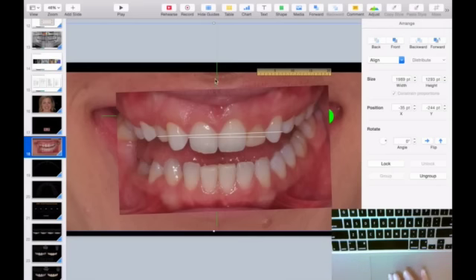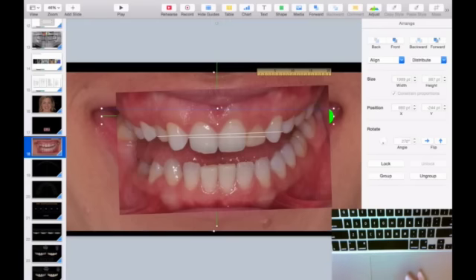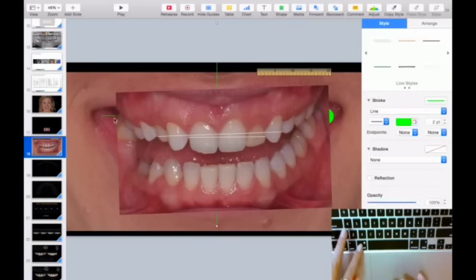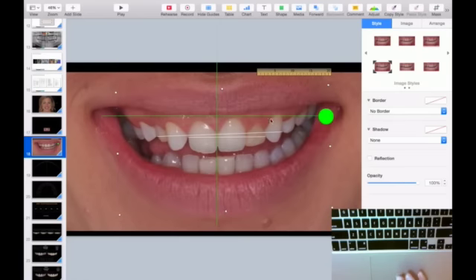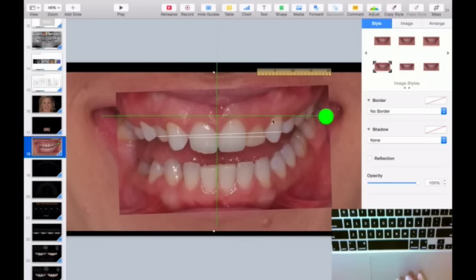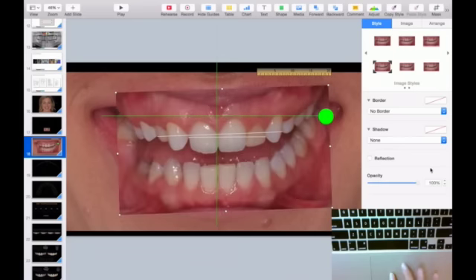So now I'm going to group this because I want my lines. And I'll bring to front. Okay, I'll send this to back. And then I'll send this to back. Okay, then I have my lines. The reference with my horizontal line. They're pretty much aligned. Okay.